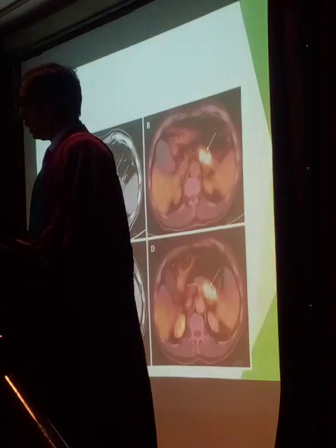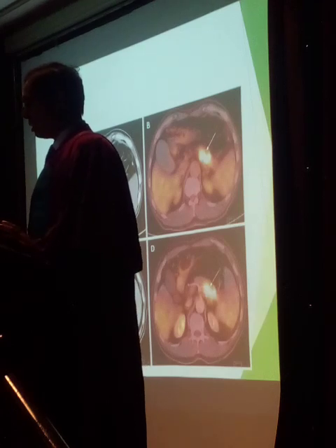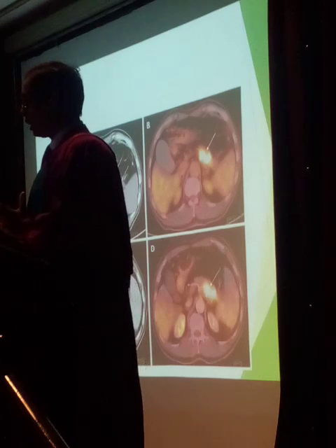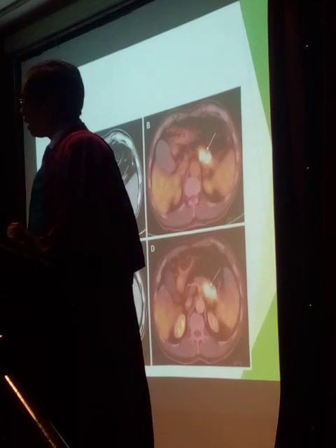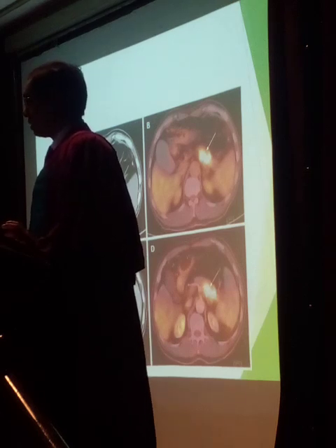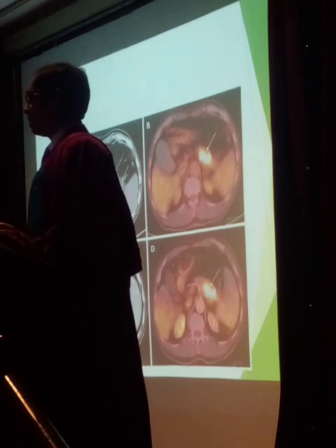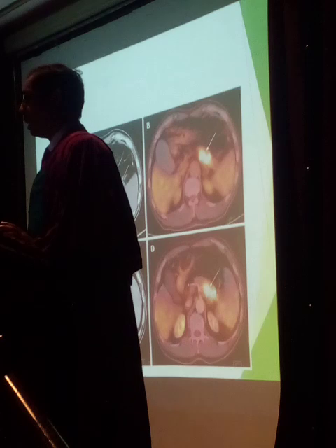Next one is the advanced PET-CT, which is available in Sri Lanka now. In PET-CT, we can assess metastasis in any part of the body. So FDG-avid lesions means that it takes this radioactive glucose into the tumor or metastasis and gives you a bright spot like this. So these high activity areas may be the primary lesion if it is in the pancreas, or it may be metastasis in other areas like the liver, the lung, even the brain.